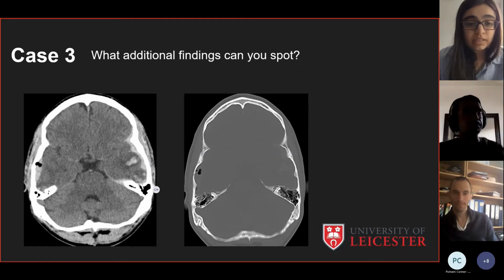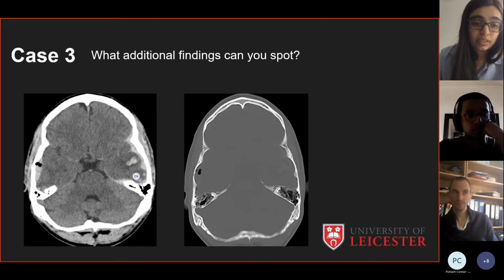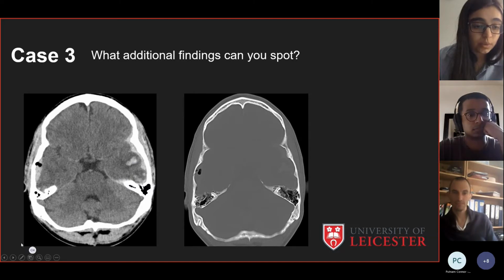And then, as you've correctly said, a contrecoup injury, which is the intraparenchymal hemorrhage that we can see here. And what you can see outlining the hyperdense, the white material, is a bit of edema, which is the black surrounding it. And so our next slide, we'll talk about contrecoup injury.